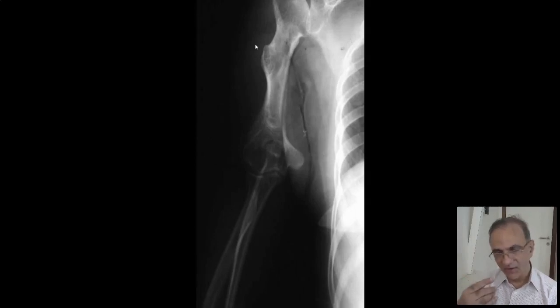Now you have to understand, when you look at osteochondromas in isolation, you'll find that they are always close to the metaphysis and are growing away from the metaphysis. Ask yourself why. Keep asking yourself why. It's fun. They're always the same. That is a single osteochondroma, which is not part of a syndrome, not syndromic like this one is. Here the bones are grossly abnormal. The humerus is short, deformed, and there is an exostosis coming out of it. Now, this is important. People don't pick it up. It's missed time and again.